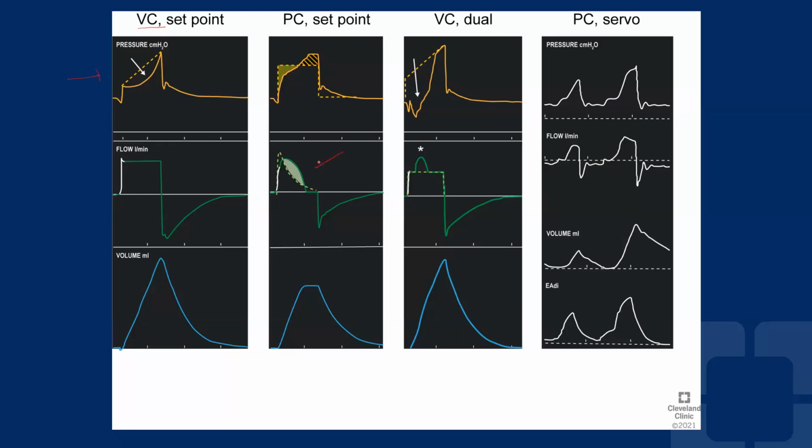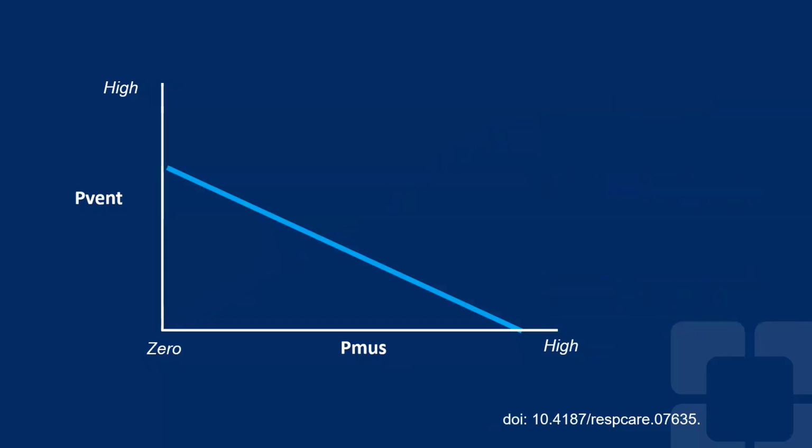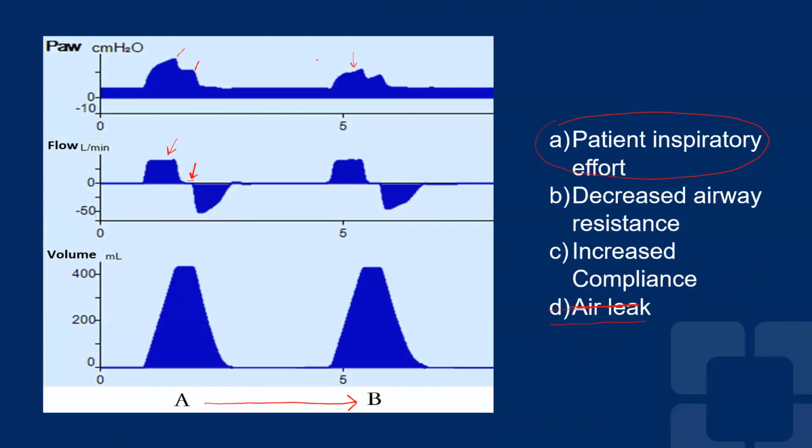On the next breath, again, we see the presence of the patient trigger the breath, the flow goes up, it peaks, and then it kind of just plateaus and it never returns to baseline. And then the flow increases again, which means that the patient is taking a breath again, and then suddenly it cycles off, even though the flow had not reached zero. The flow kept going up, and then the patient exhaled, and now the flow is at zero, meaning that the patient has exhaled completely, but the volume did not return to baseline.